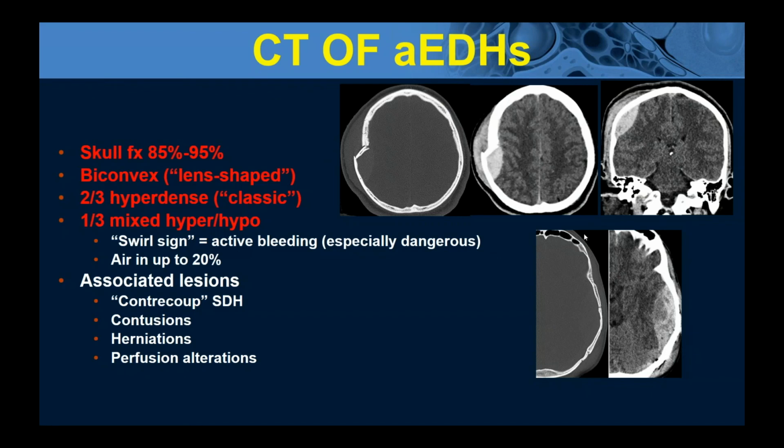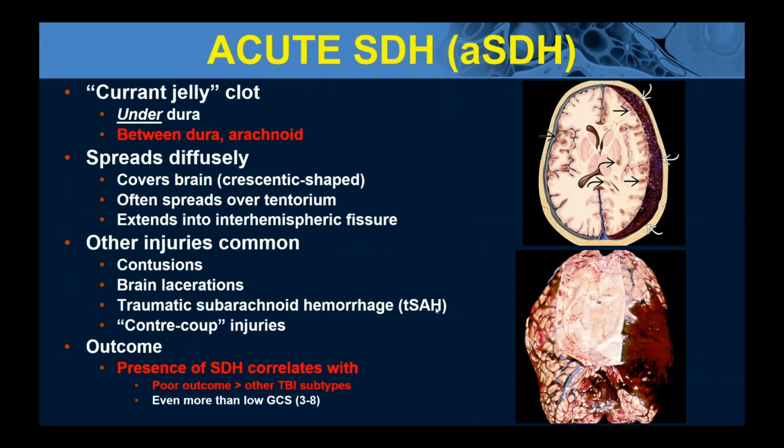Right below it, we have another case with what looks like a much less ominous skull fracture. It's a small linear skull fracture. It's not displaced, but look at what it did. It made a big hematoma. These areas of iso or hypodensity compared to the adjacent brain mean that there is active bleeding there. And that means that the hematoma is expanding literally as we're looking at it, because the blood is seeping into that space between the skull and the dura, and it's under arterial pressure.